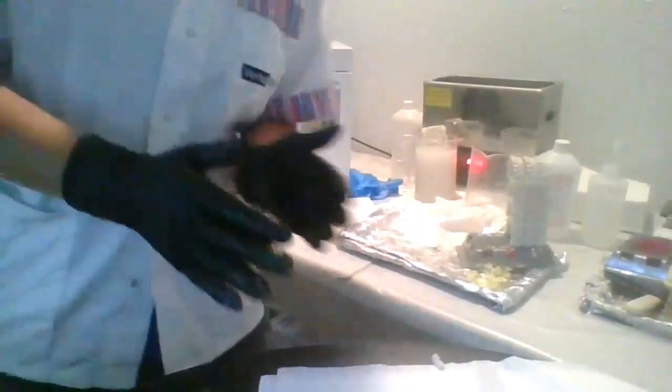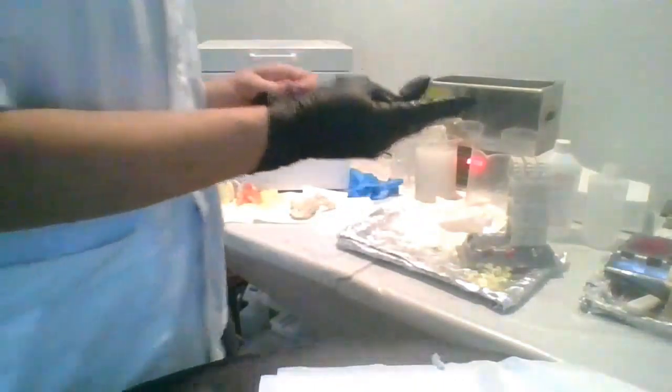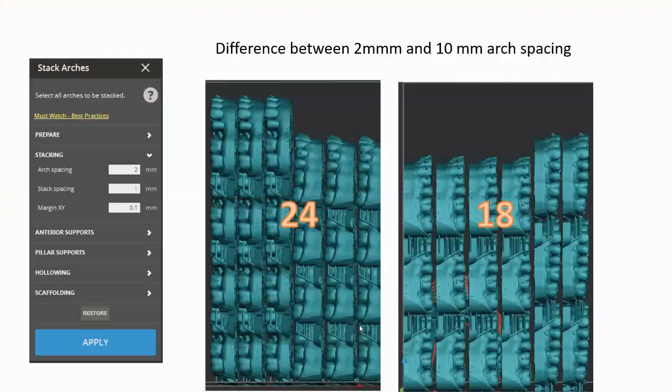All right, Stein? Good, then I will take everybody through a few of the options. So if you open the stack functionality in the software, Adrienne, I'm going to mute you for a second.